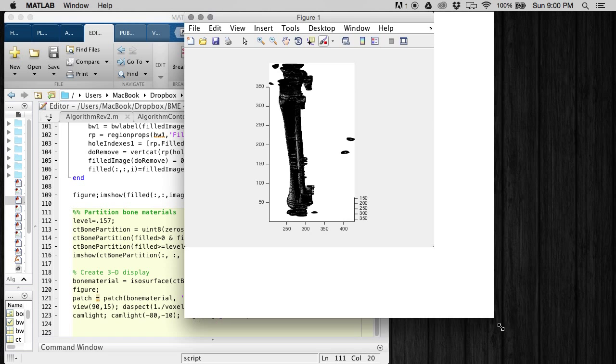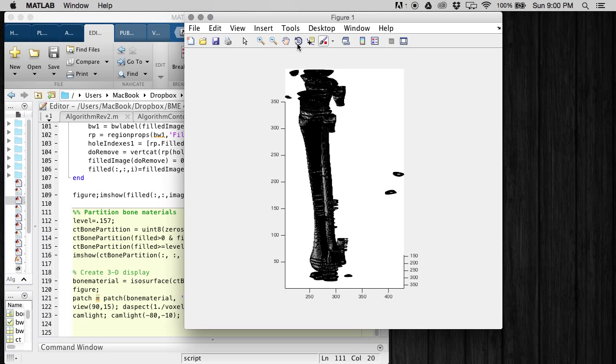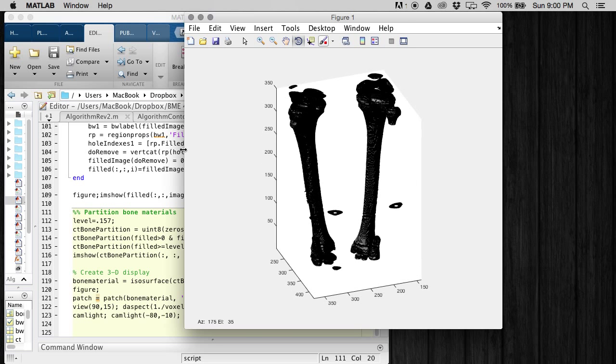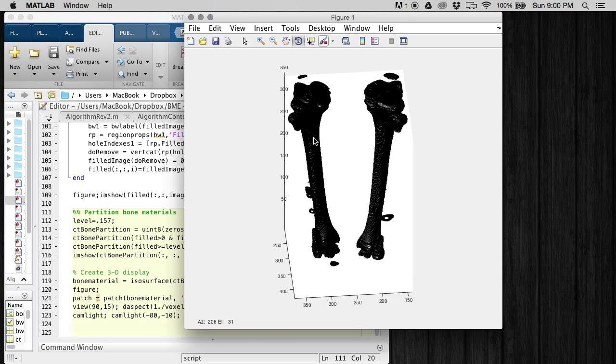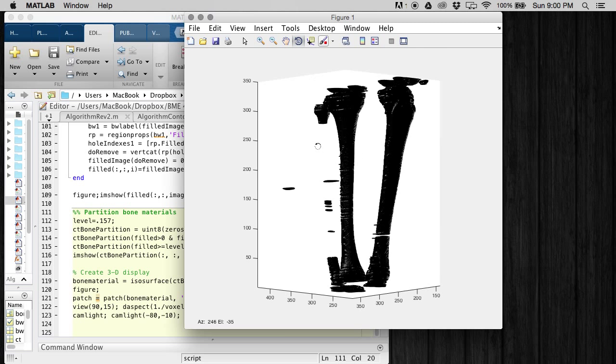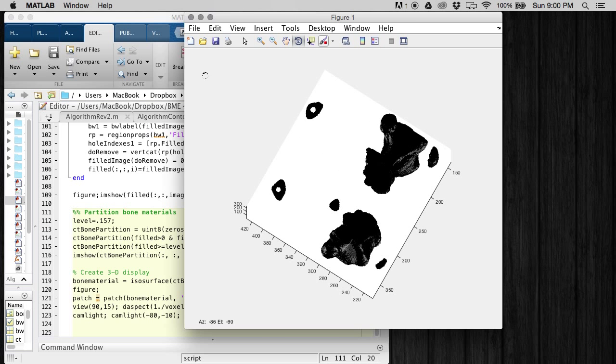So there we have it. As we can see, our more complex contour filling approach is not quite as robust. It ends up segmenting, but it's looking pretty smooth overall. So this needs to be cleaned up, but it is another approach for the segmentation and does quite a good job here.